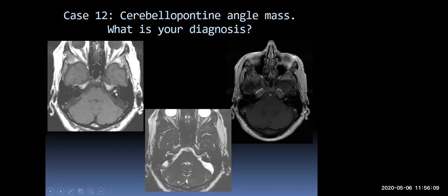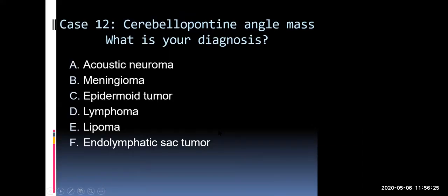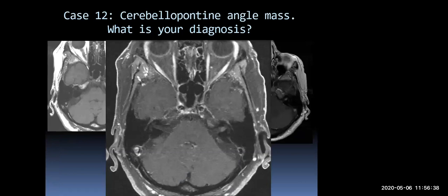So this is hyperintense on T1, isointense to brain on FIESTA/CISS and T2, and really doesn't enhance much if you think about any enhancement. And then if you do a fat suppression, it disappears. And there's only one thing that would do that: a tumor that's following the signal pattern of fat. So what you're looking at there is actually an IAC lipoma. They're extremely rare tumors, and they're fairly innocuous, and you can just monitor most of them. They don't cause any harm.